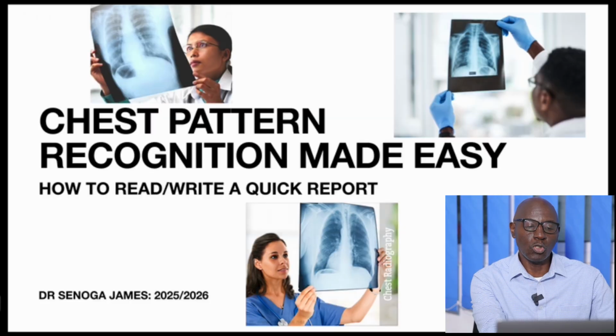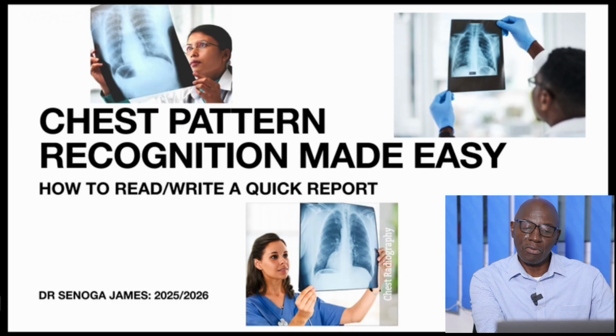You must be able to quickly get the signs. If you are a medical officer, a chest X-ray will come and you're working without a radiologist. This is very important for you, so that you may get a quick preview. Before the radiologist comes in, you can already treat the patient in the right way. So today's session is about that.